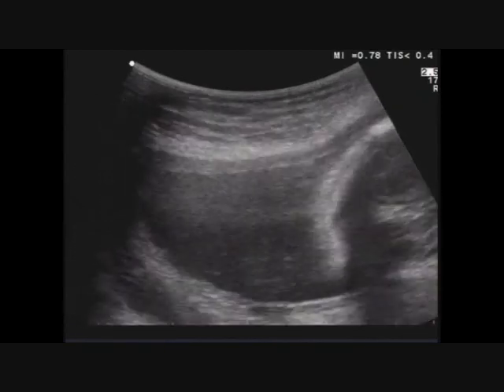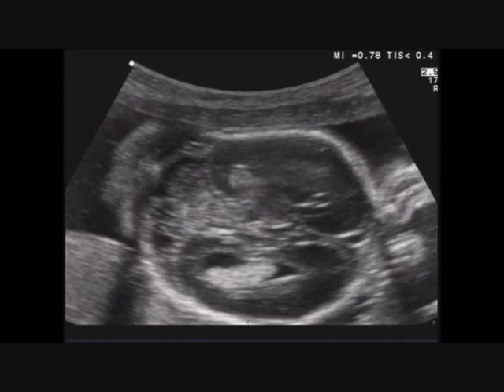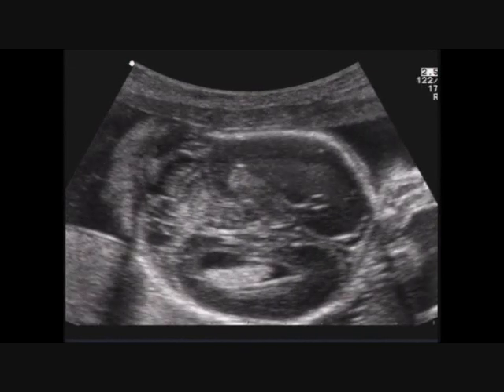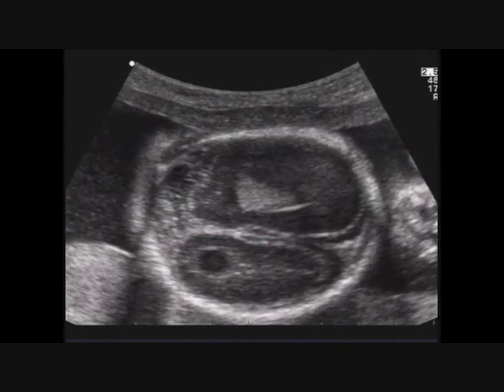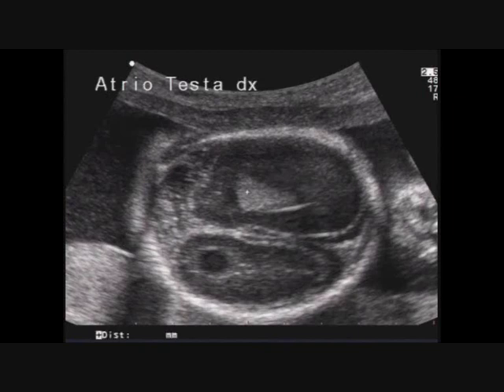For example, you can see a hydrocephaly, usually really modest, borderline, that frequently involves the occipital horns, but there isn't one in this case. But if you pay attention to the median line, you can observe what kind of confusion there is in this particular zone. This confusion is linked to medialization of the frontal horns, which go up a little.